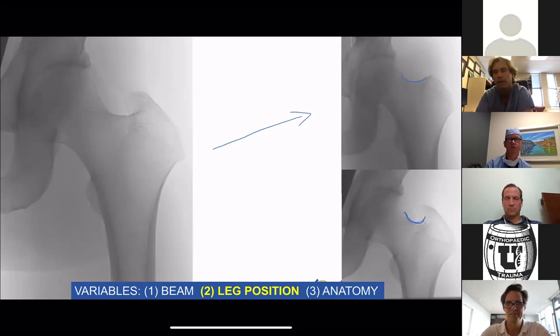You also see that it changes the relationship of the tip of the trochanter and the center of rotation of the head, right? So in the bottom, in an extended view, it's going to look a lot more varus than in a flexed view at the top. All right, so the position of the limb or the position of the fragments is going to have an effect on your ability to judge whether you have an appropriate reduction or not. And that's why that project was so complicated, because cases differ. We have different pieces associated with some pertrochanteric femur fractures than others.